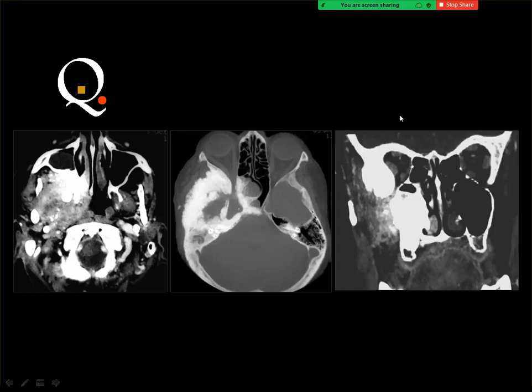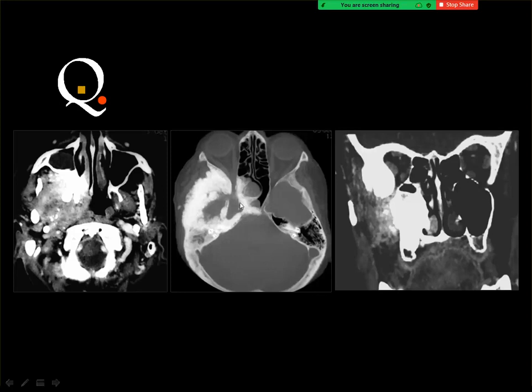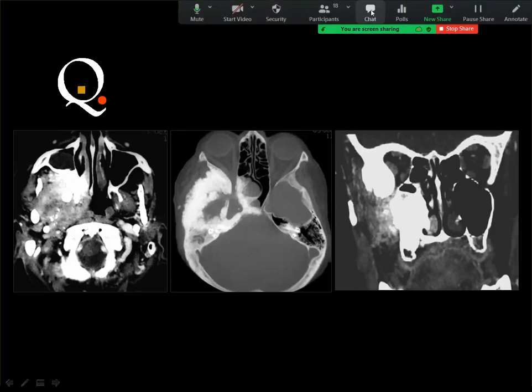This patient with what looks like an extensively sclerotic lesion affecting the greater wing of the sphenoid and also some of the lateral wall of the ethmoidal air cells, the pterygoid plates associated with this mass. Actually, I know that this is a difficult case, but you may collect these facts to reach a diagnosis.